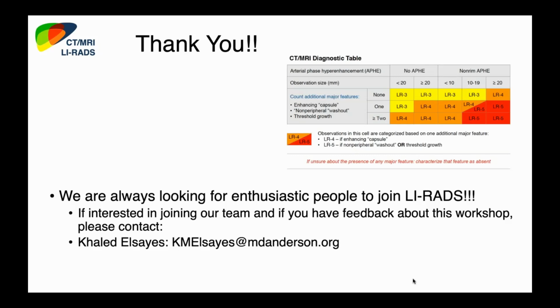I've been involved with LI-RADS for a few years, but I always have a problem with the new table where we say that to differentiate between LR4 and LR5, if there is washout, you change it to LR5, and you showed an example of that. Number one, how many times do you actually see a lesion which is arterially enhancing between 10 and 19 millimeters, but with no washout, with just a capsule? I have never seen that. I have never personally seen that.